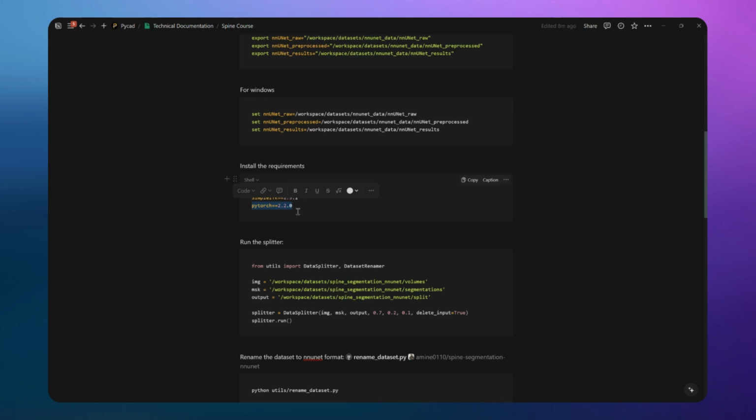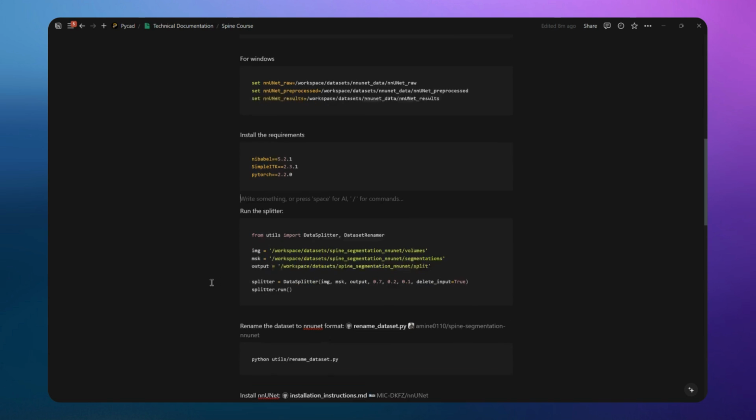So I'm using 2.2, but if you prefer something else, you can use it. You need to go 2 point something, or 2.0 or larger. Smaller than that, it will not work as a version. Okay. Then here I am just showing you how you can do the splitting.